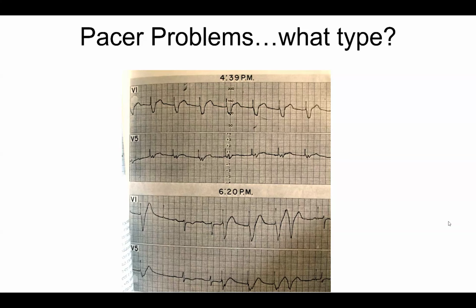It seems unlikely, as this rate is faster than 150 beats per minute. And we see here what the pace to pace interval is. It's quite a bit slower than that. So clearly the pacemaker is not programmed to pace at this fast of a rate. Now you could argue maybe there's a rate responsive feature on the device where it's sensing activity and increasing the heart rate. But I think this is an example of undersensing.